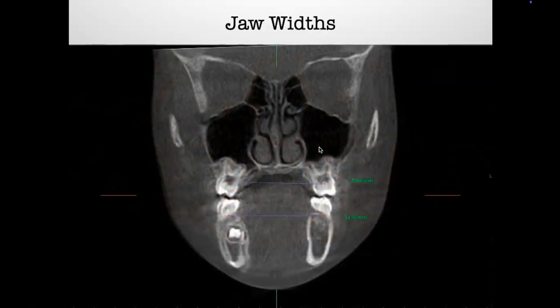And then when we look at the jaw width, this is what tells us what we did, right? So now remember, from 8 to 9, that patient would have grown about another 2/3 of a millimeter, right? So we don't get to take credit for that. But anything above and beyond that 2/3 of a millimeter that she would have normally grown in that year is going to be the effect that we have with the expansion.